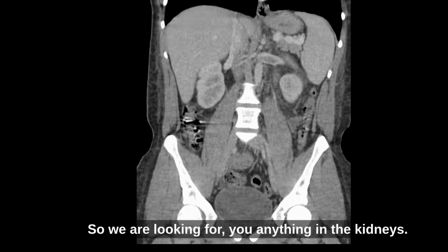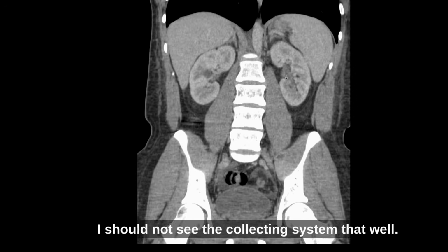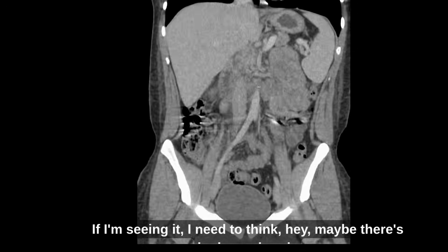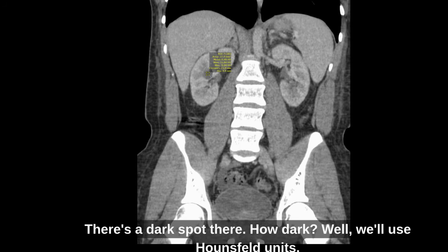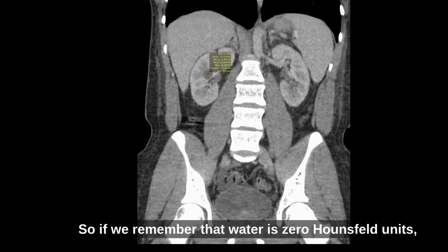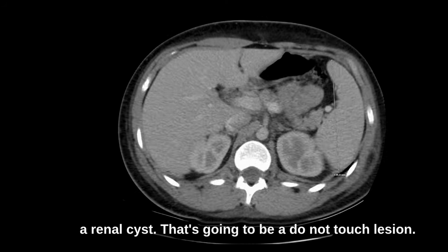So we are looking for anything in the kidney. I always look at the enhancement pattern first. They're enhancing symmetrically. Is there hydronephrosis? I should not see the collecting system that well. If I'm seeing it, I need to think, hey, maybe there's hydronephrosis or extrarenal pelvis, something like that. But these collecting systems are good. Then we look for any renal lesion. There's a dark spot there. How dark? Well, we'll use Hounsfield units. And we get 6. So if we remember that water is 0 Hounsfield units and this thing's 6 Hounsfield units, that's really helpful because we just diagnosed a renal cyst. That's going to be a do not touch lesion.